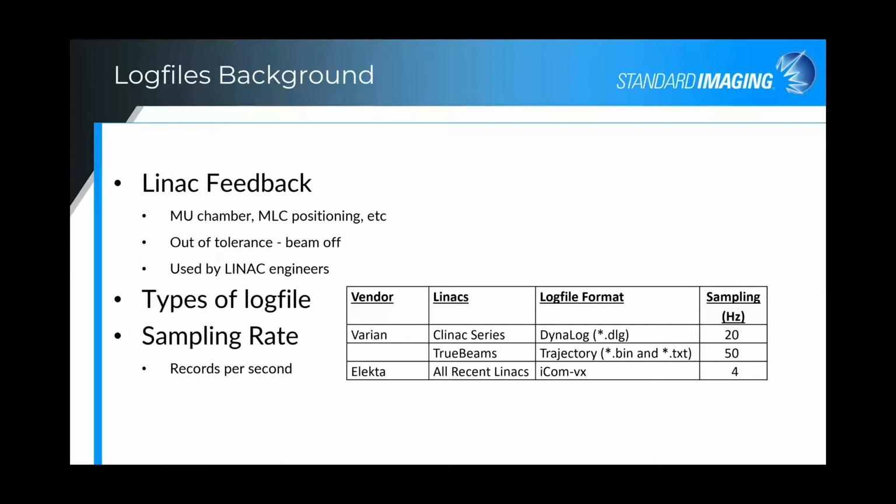And so, it's not a perfect system. There is expected to be some variation from the plan, clearly. But trying to determine, for example, how many leaves or how many segments with different monitor unit variation, still within LINAC tolerance, can be clinically significant, we could talk about that topic quite a bit more. But I'll just move on.